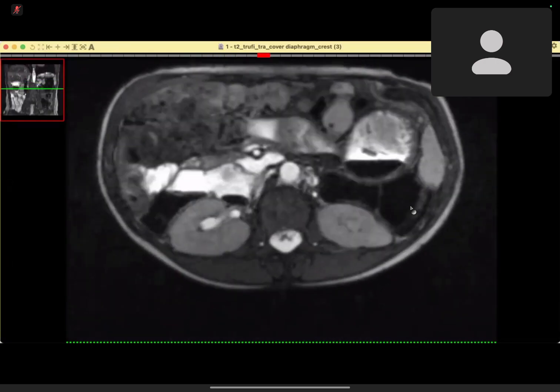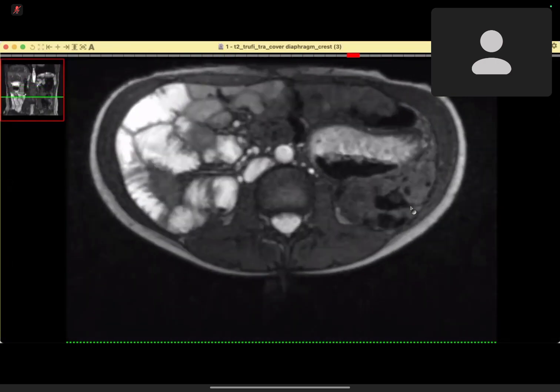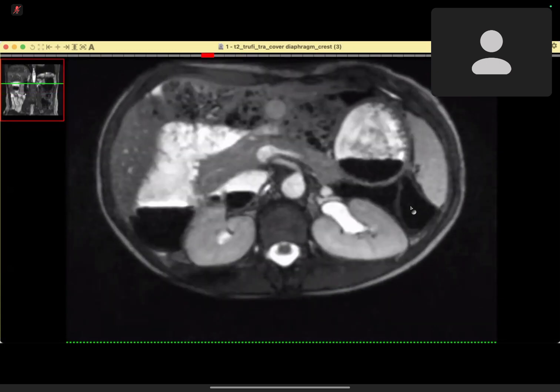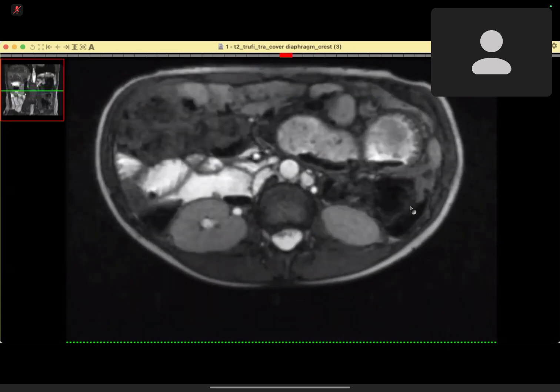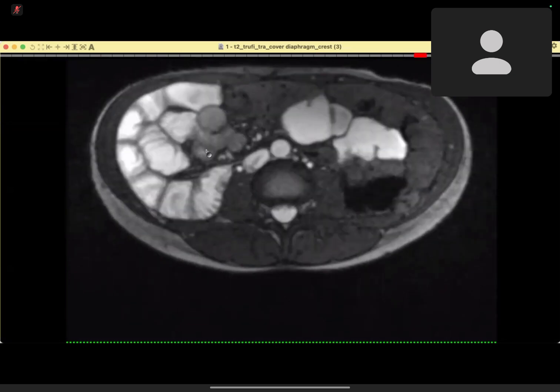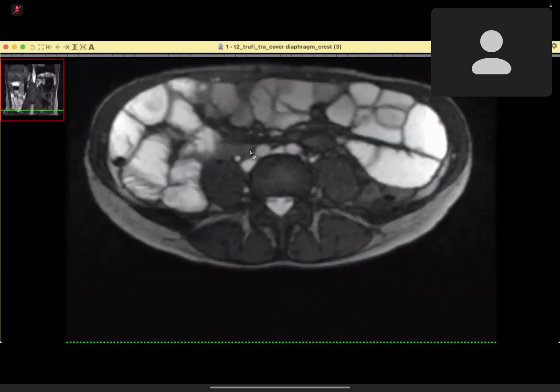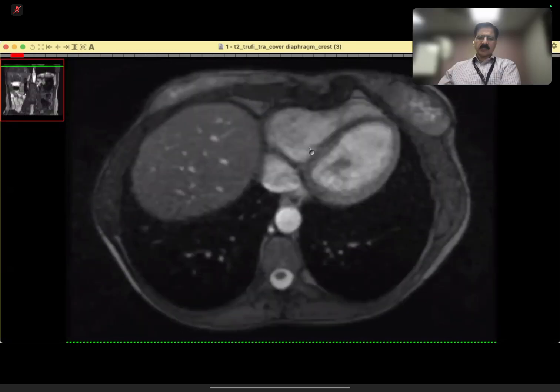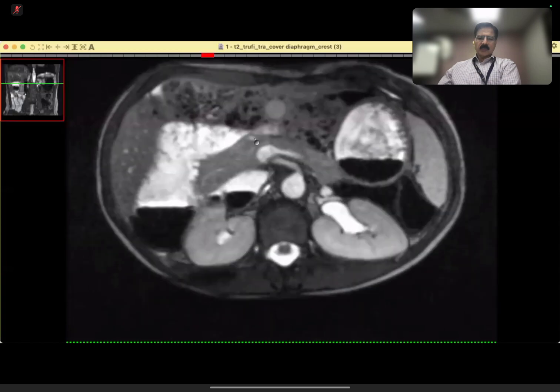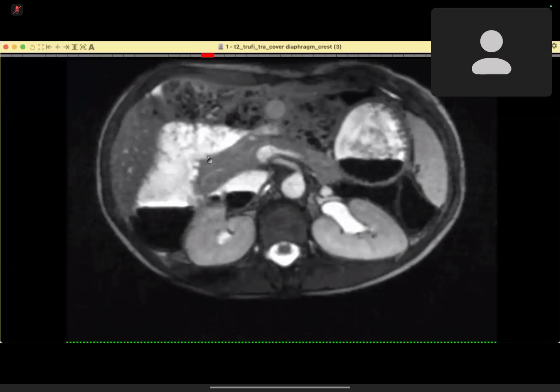Yeah. So I'm starting with the stomach, and I will trace it into the duodenum. After the duodenum, I am now seeing the proximal segment of the jejunum. I can see that the jejunum is clustered on the right side. Just 1 second. What is this? This structure where I'm pointing out.